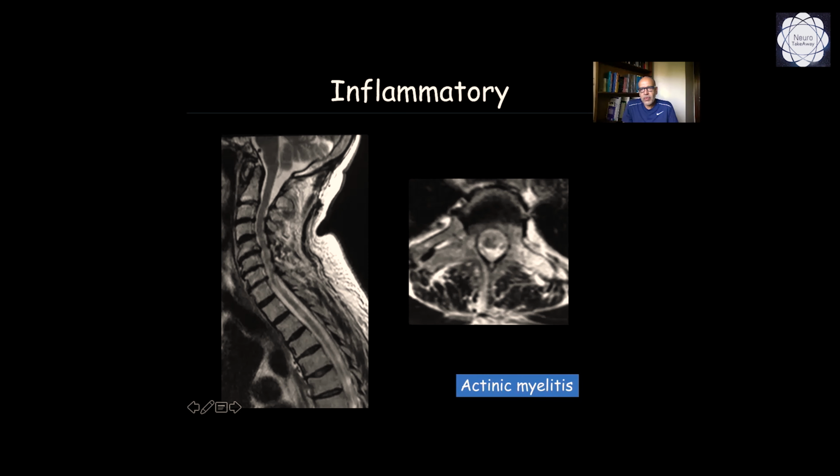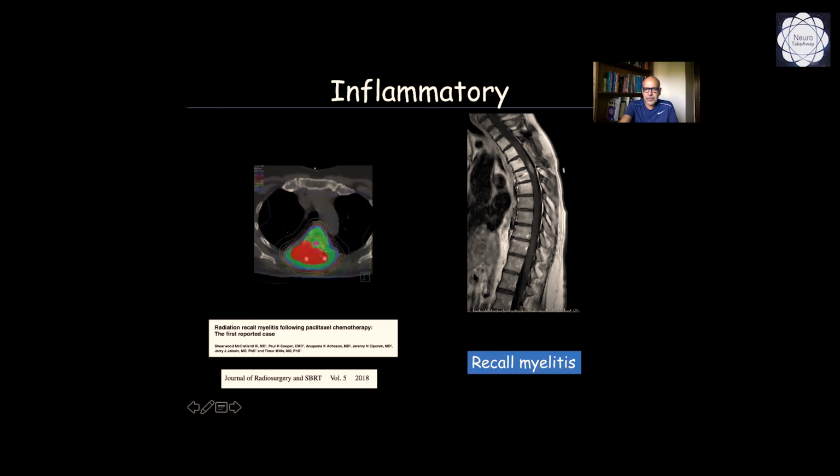And then we went back to the medical record and we found that this woman had been treated with radiotherapy for a lung tumor. So this is a very important and very typical finding of radiation myelitis, and stresses the importance of knowing the clinical history of the patients.